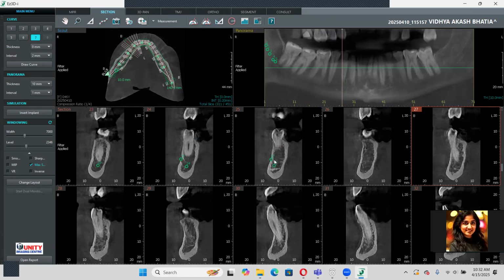See, our last point is 27. Till 30 points, it marks the canal. And after 30 points, if you still want to mark, especially in sections, 1 mm sections, it gets finished. So you can finish this off and then click on this icon, draw canal icon, and do it again for the rest half.